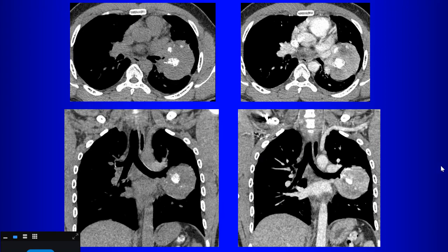What's different about the lesion? It's enhancing, right? So are you worried this is neoplasm? Yeah, you're more worried that this is neoplasm given that degree of enhancement? Is there anything else you might consider for this patient?